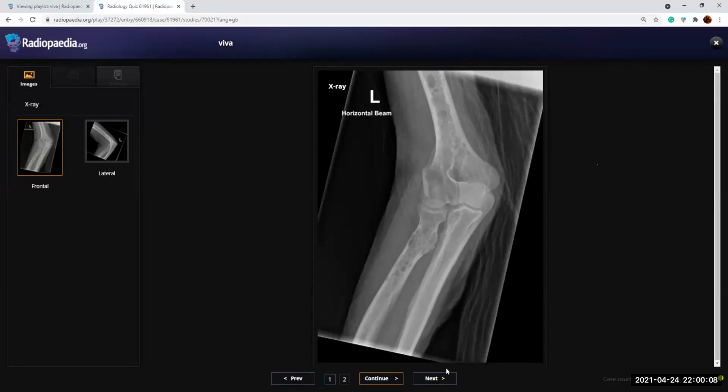Okay. You said eosinophilic granuloma and beveled edges. Which age group do you see the eosinophilic granuloma? It is in the pediatric age group. By seeing this, would you say it's pediatric? No, this is not pediatric, and it's too many lesions for eosinophilic granuloma.